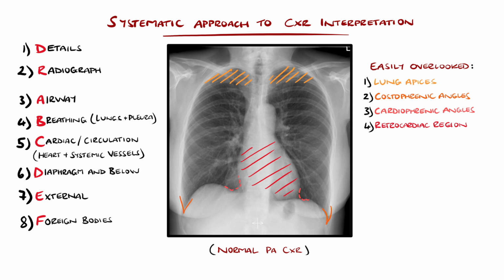Hopefully this has given a general understanding of an approach to chest X-ray interpretation. Of course, there are further nuances and intricacies, but this approach will cover the majority of chest X-ray interpretation.